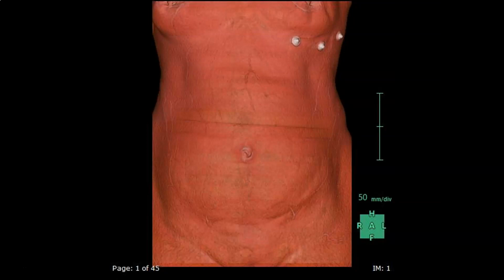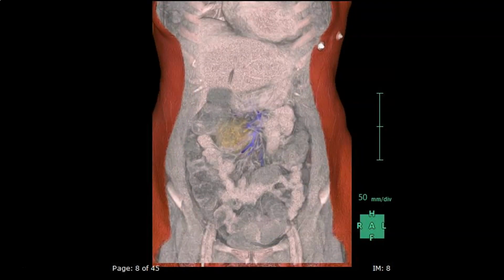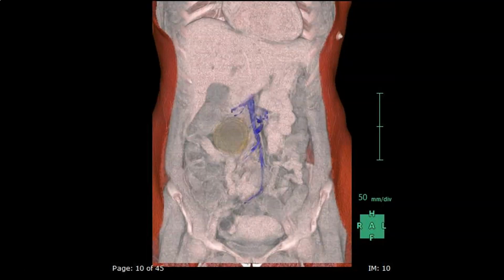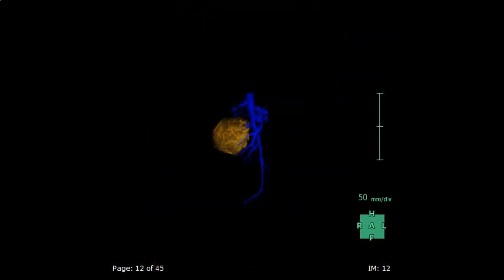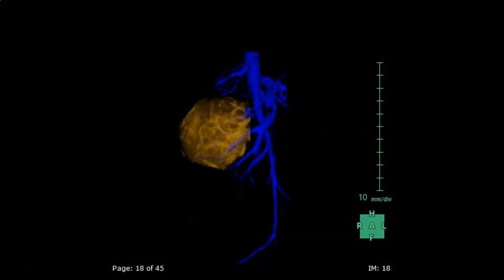This is a three-dimensional reconstruction of the CT. The lesion is shown to the right of the mesenteric vessels. We see how the jejunal veins, which are normally directed towards the left side, are making a turn here together with the mobile lesion.